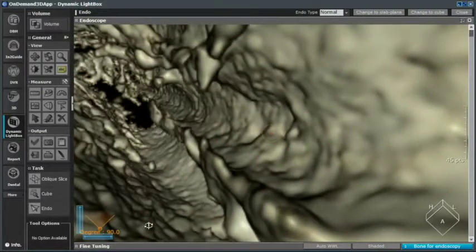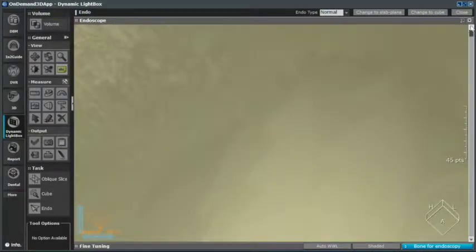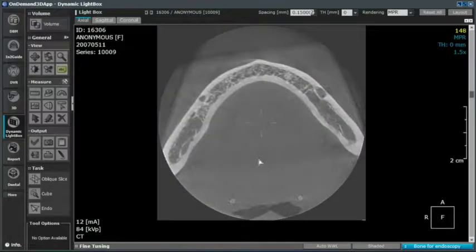Okay, you tell me how you could find fat in that area. You're not going to be able to, all right? You can't even find the nerve in the vessel. You'd have to do MR in that area to see it. But can you imagine trying to take software to go in there to see how cool that would look, and you're looking and looking, and you're never going to get there. It's not in our paradigm just yet.